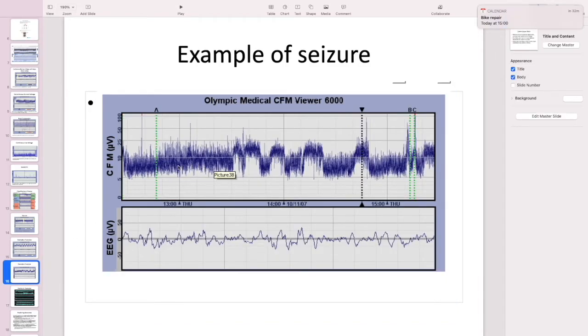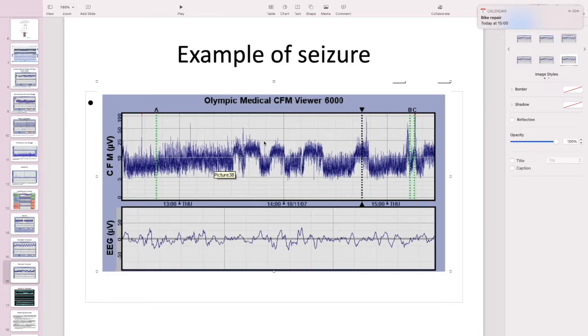And then this is another one that's showing a sort of relatively normal trace, lower border above 5, upper just above 10, maybe some sleep wave cycling here, but then these spikes, which are all seizures throughout this, with some areas of resolution in between, but not very long. So this is an hour, 2 o'clock to 3 o'clock, and it looks like 1, 2, 3, maybe 4 seizures within that time.